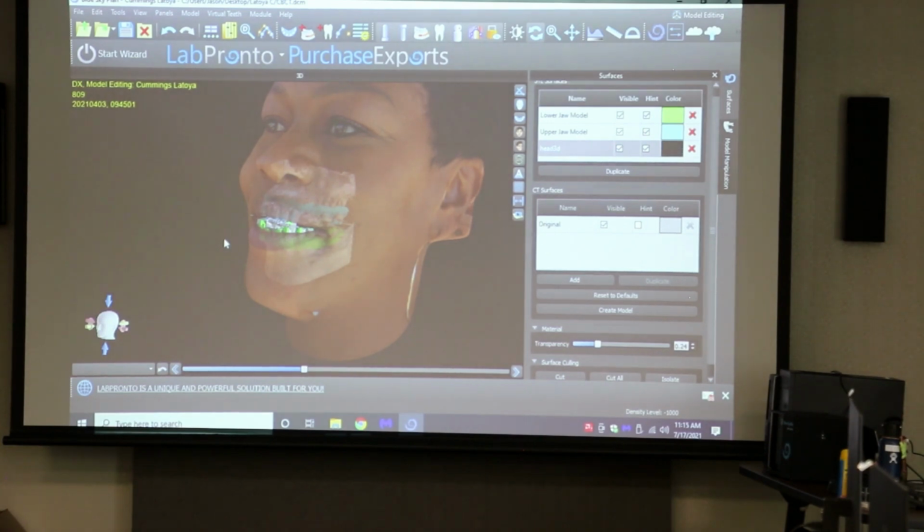So this slider bar down here, right? I guess then you could do the wax up. Notice you did tweak the transparency on all of these, so turn that back up a little bit. What were you doing there on that one? Generally you'd want to turn that dial all the way up to almost the upper lip, so you can get the skin, right? So we have to go back a little bit.